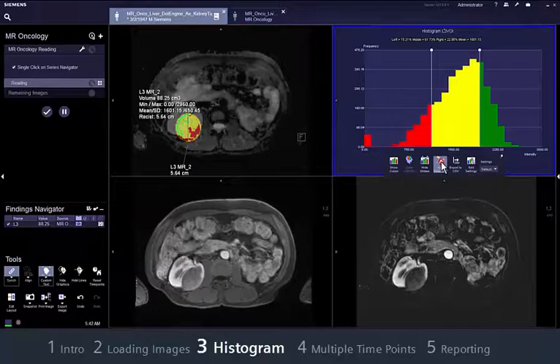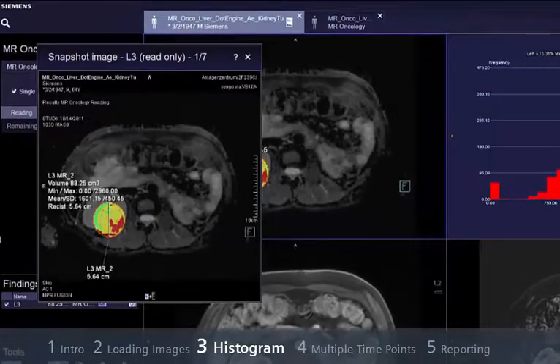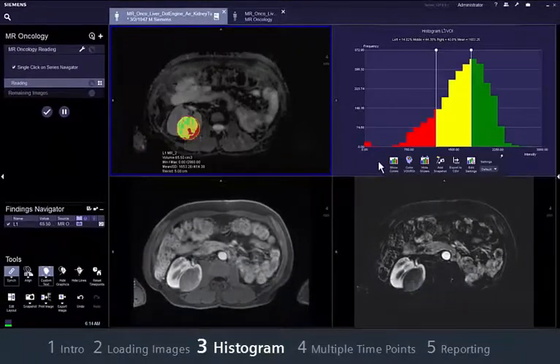To save the histogram as a finding, use Add Snapshot. This will add a snapshot of the histogram to the corresponding finding. If the color back mapping of the VOI or segmentation result is enabled, an additional snapshot of this segment is added to the finding. On the histogram toolbar, there are additional tools available to adjust the histogram.